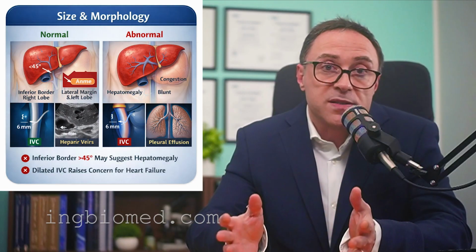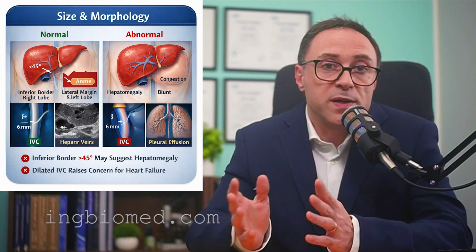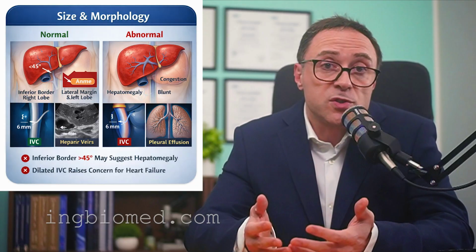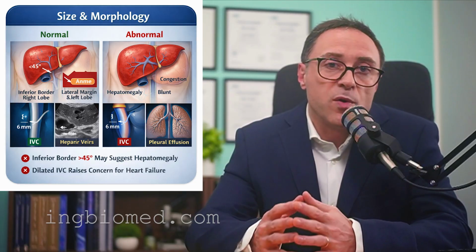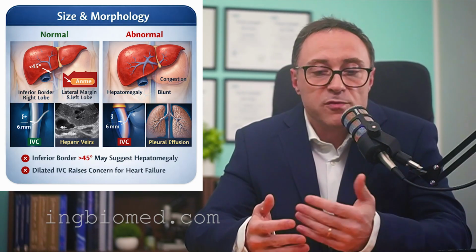And next, we evaluate liver size and morphology. Although measurement along the mid-clavicular line has historically been used, it has limitations due to respiratory variability and anatomical differences. More reliable indicators include the morphology of the inferior margin.